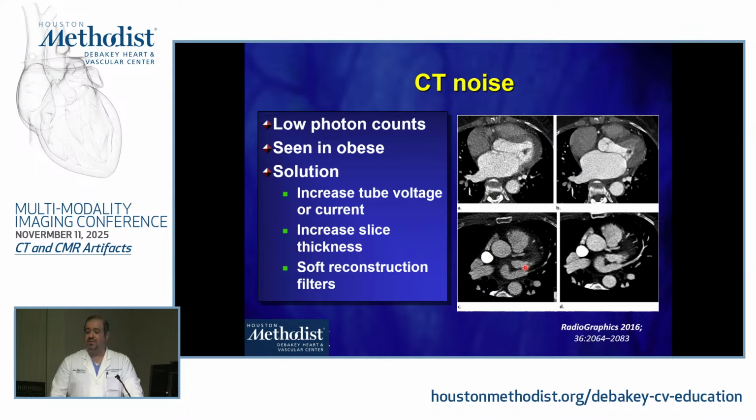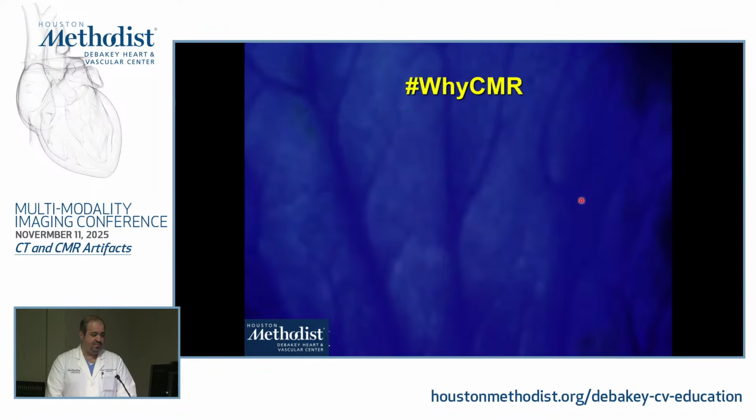So these are also some of the post-quality checks that I do on my patients after a cardiac CT. Look for coronary motion, look for respiratory motion, and then look for any noise within the cardiac CT images.